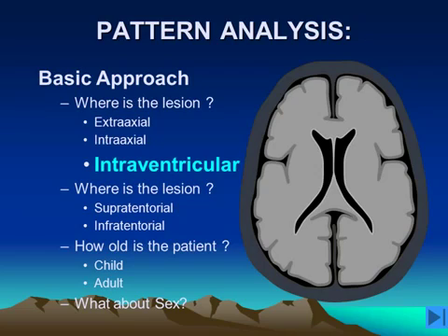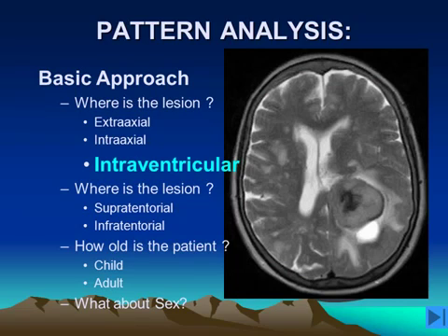There are two lateral ventricles, a third and a fourth ventricle. Most commonly, intraventricular masses are seen within the lateral ventricle, and the most common location for a lateral ventricular mass is in the region called the atrium or trigone, and these lesions are typically related to the choroid plexus, which is in this location. This is a patient that has an intraventricular meningioma.